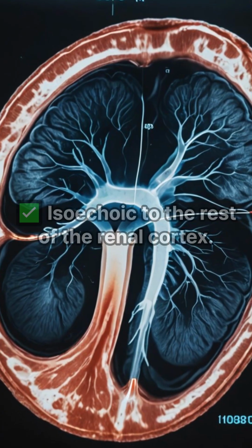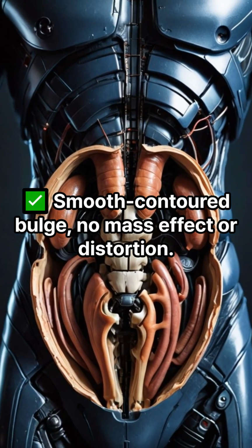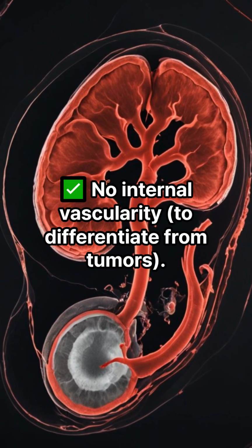Sonographic appearance. Isoechoic to the rest of the renal cortex. Smooth contoured bulge. No mass effect or distortion. No internal vascularity to differentiate from tumors.